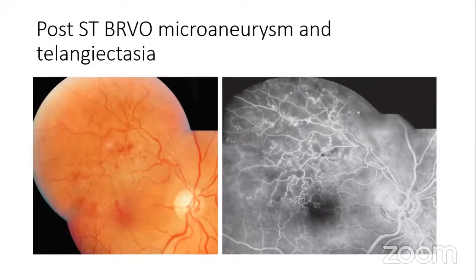Okay, now, if you look here, these vessels are abnormal. Now, if you get to the macula, the vessels are bridging themselves. It's from vein to vein. They are trying to cause a bridging from this end towards this end across this area. Now, this was an ischemic branch retinal vein occlusion, and this is an attempt to jump the ischemic capillary zone.